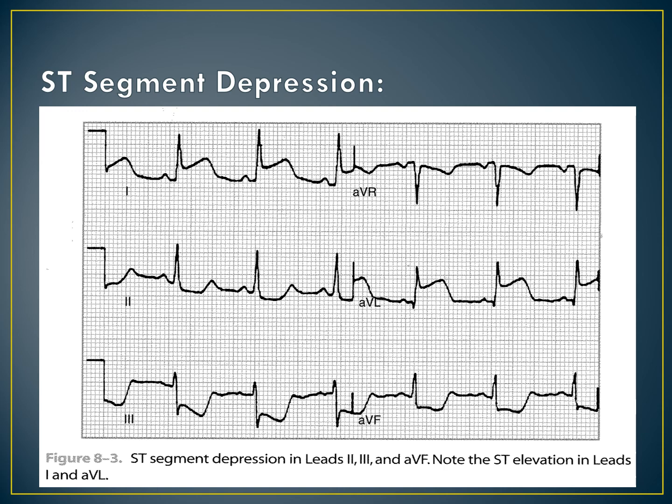Here you will see ST depression in leads 2, 3, and AVF, with associated ST elevation in leads 1 and AVL.